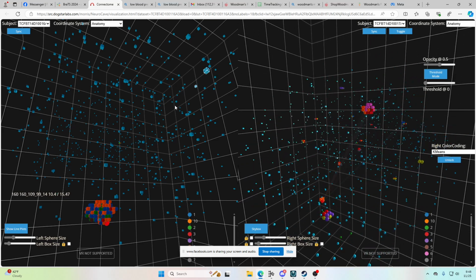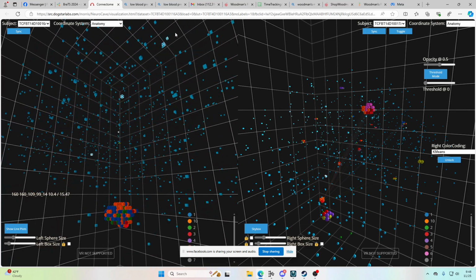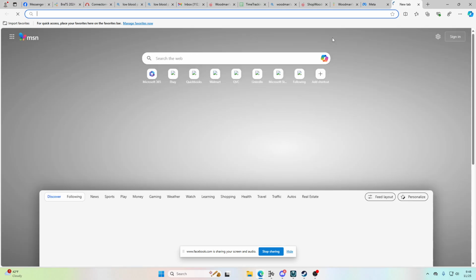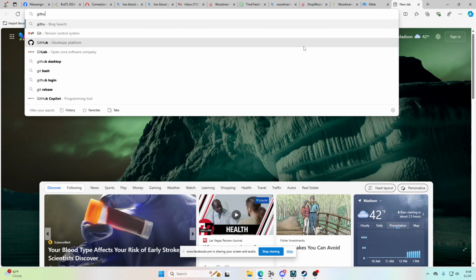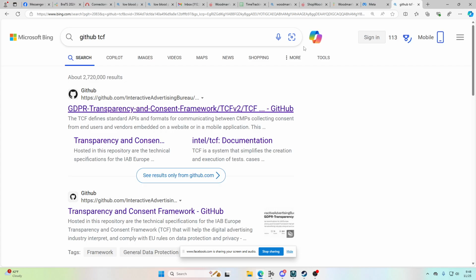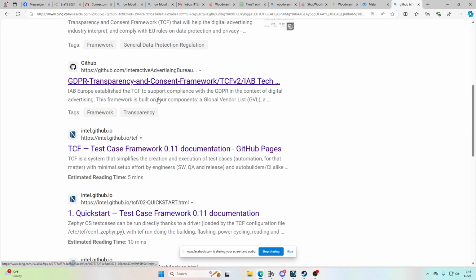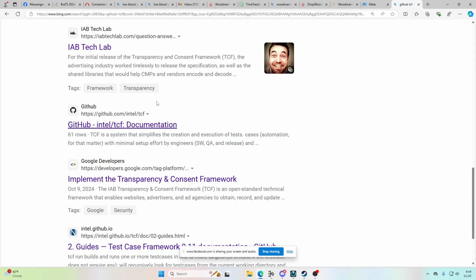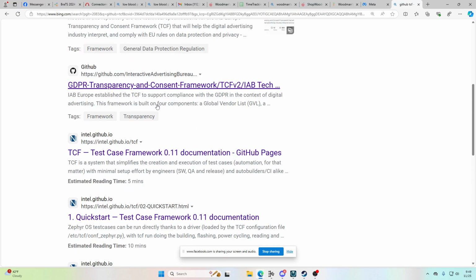But what's interesting is that I apply the Tumor Connectome Framework. I got this off of GitHub. Let's see, GitHub TCF. Let's see if it'll find it. That's different stuff there.